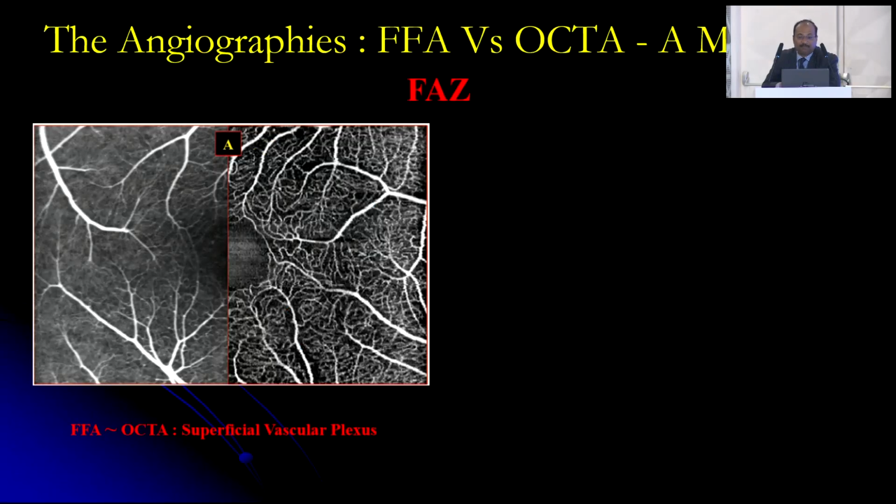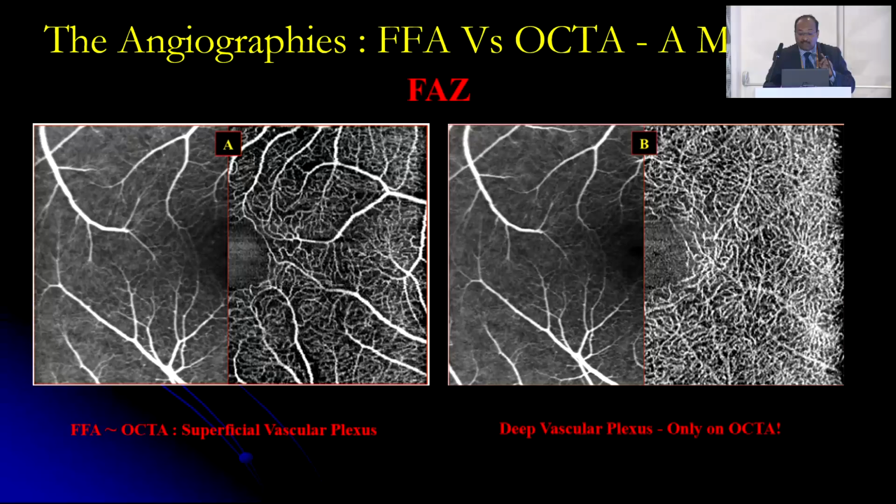So the matchup, FFA versus OCTA. Dr. Lalit's talk just now kind of highlighted all that, but understand that the FAZ on FFA correlates very well to the OCTA superficial vascular plexus FAZ. Okay, so these are very comparable. But understand also that the FAZ on the deep vascular plexus can only be studied on OCTA.